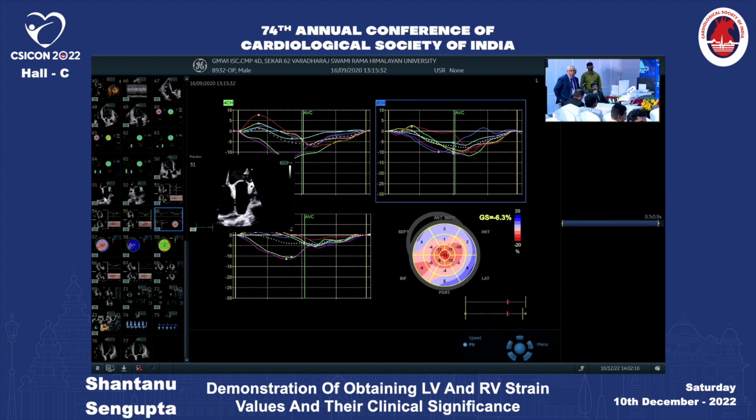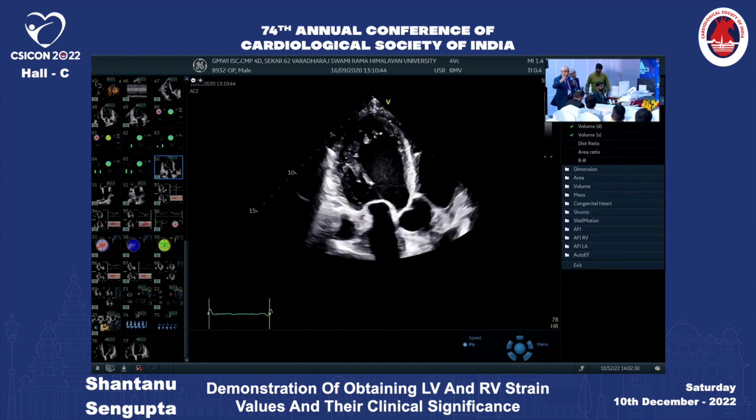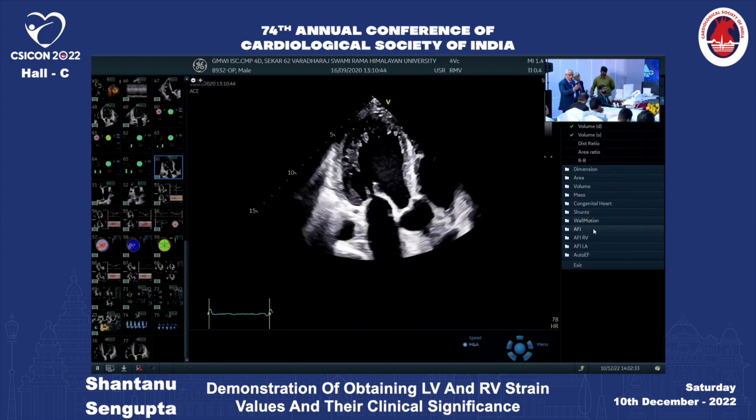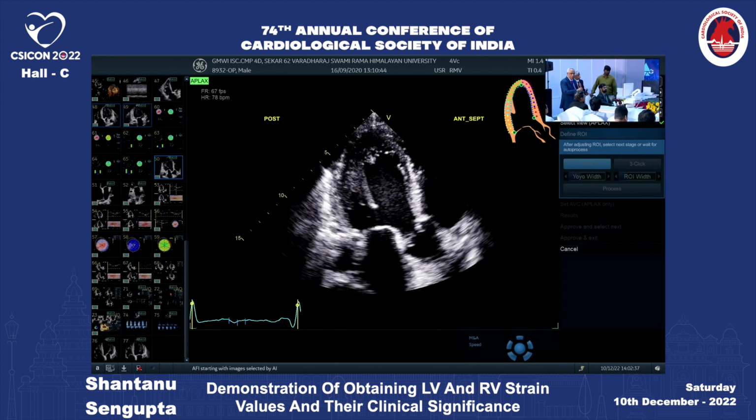Regarding the placement of the markers on the area of interest, both the septal and the lateral, to avoid possible errors, how do you suggest? Yeah, I will tell you. Can you go back and mask the thing again? You should not select the insertion point. You should go a few millimeters away from the insertion point into the annulus. So this is the click. What he's telling is we should not be here, a little bit inside.